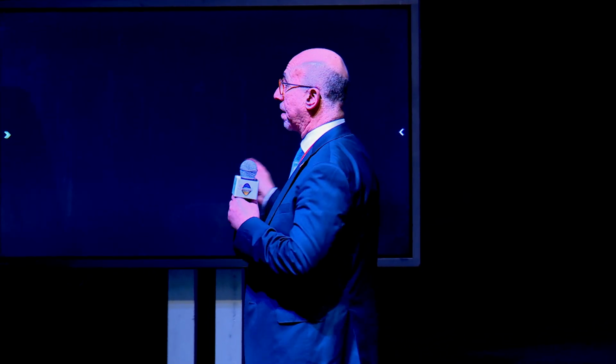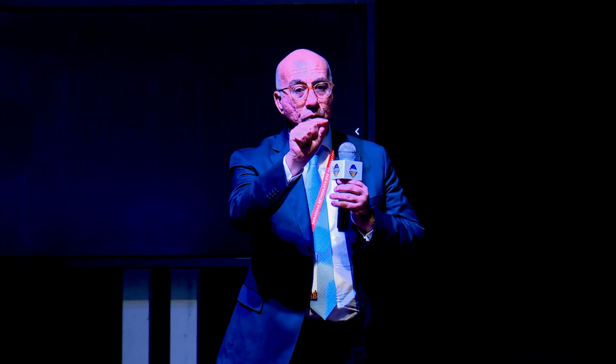If you go back to Ashish, ready? Yeah, it's a total paradigm shift in our thinking, because it's very hard for any classic refractive surgeon, all of us, to imagine that with a 3 mm optical zone you can correct that. But imagine that the total ideal shape is defined by the ideal shape of the cornea that will deliver the ray to the fovea, okay?